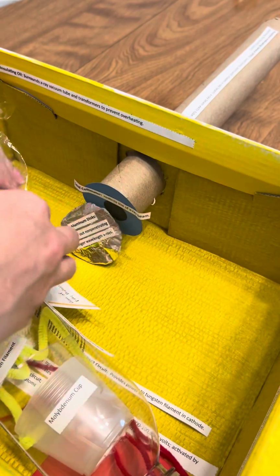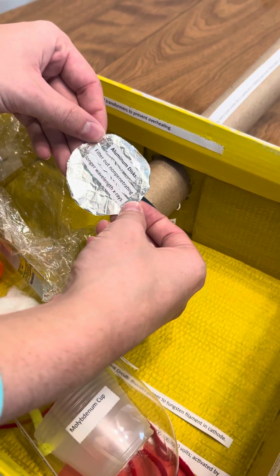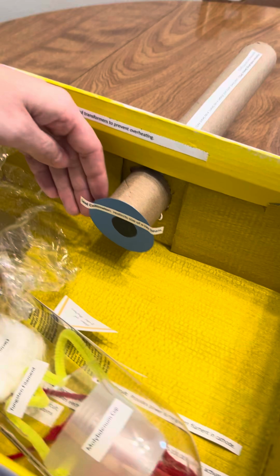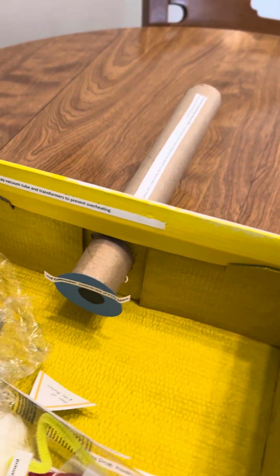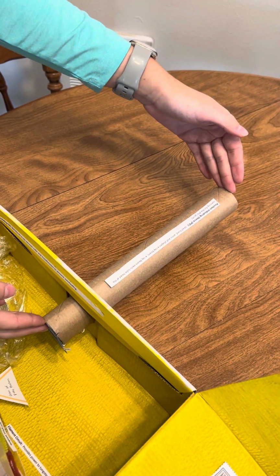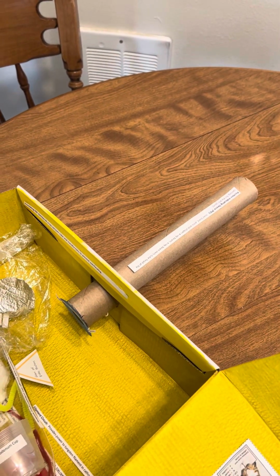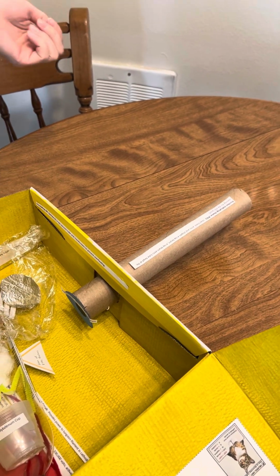This lets only X-rays exit the tube head and keeps the oil and other parts of the tube head inside. Next piece is the aluminum disc. This filters out the non-penetrating, longer wavelength X-rays. Then it's going to go through the lead collimator, which restricts the size of the X-ray beam. And lastly, to exit the tube head and come in contact with the patient, the X-ray is going to travel through the position indicating device, which is lead lined and shapes the X-ray beams and directs them directly where the radiograph is wanting to be taken.